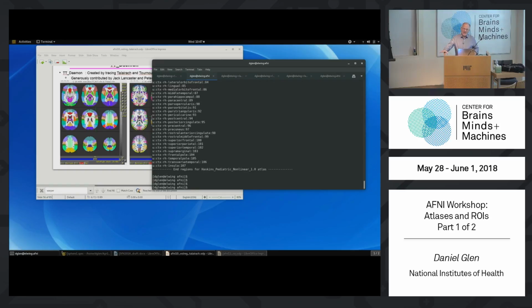Now, if you wanted to add something specific, so if you wanted to add the Marmoset Atlas or add the Macaque Atlas, then we give you a separate file called custom_atlases.niml. And custom_atlases.niml has exactly the same format, except it's got the space definition and the atlas definition for the new atlas. And you can extend that as you like. You would create a new supplemental atlas directory, and that would be where you'd keep all your list of custom atlases.